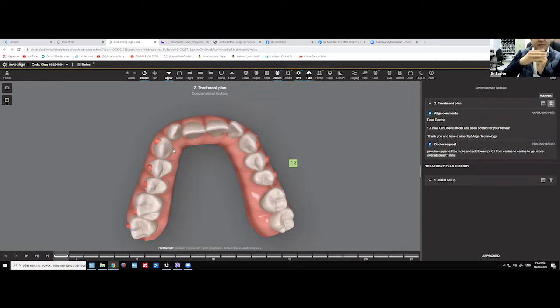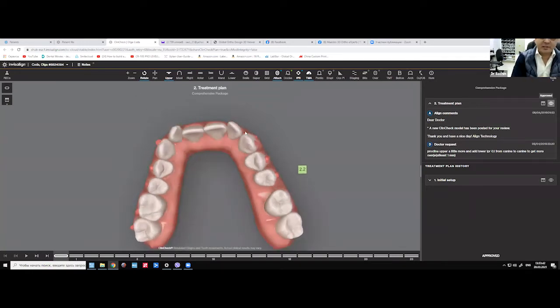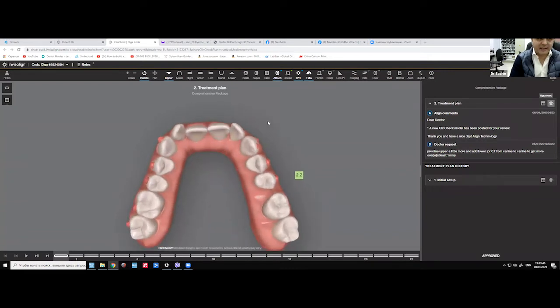Any tooth which is covered by the adjacent tooth, where you're trying to make movement, will not move. In this case, with no attachments, the lateral incisors on both sides moved exactly as in the planning, because you can cover the entire tooth with the sheet, right? So whenever you see movements which can engulf the entire tooth for rotations, you can avoid attachments. But if you can put them, it's good.